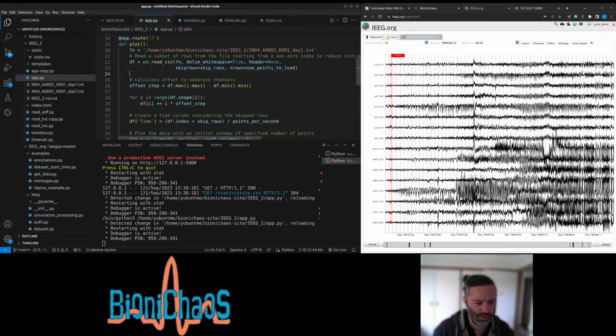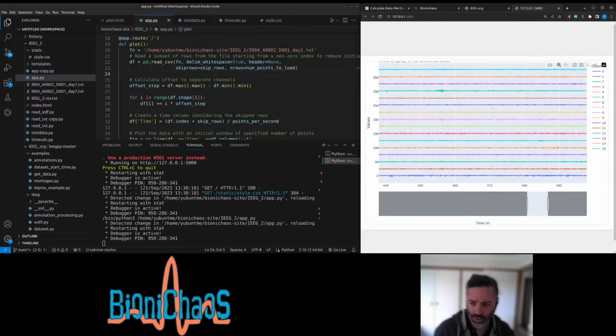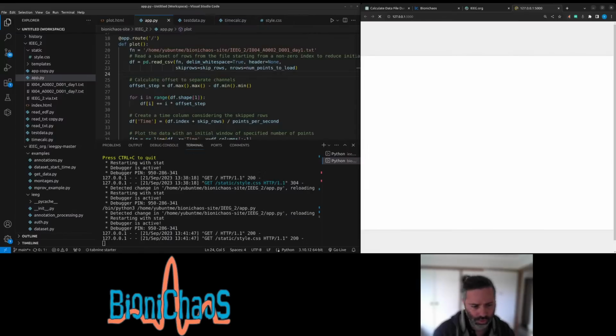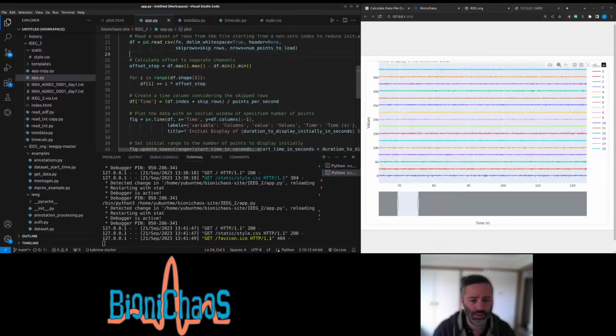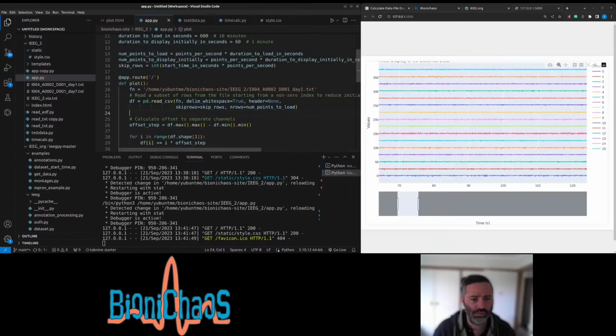Check if it's still working. Not to begin with, it's also loading in a smaller window. I don't know why. Then it opens up. Obviously, it's the styling or something that is taking effect only after the window is being loaded. So I have to fix that.